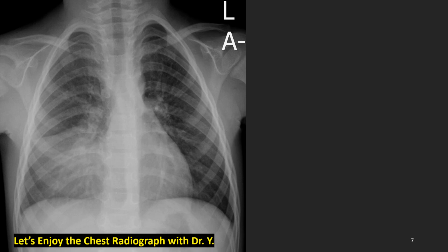What do we see with this frontal radiograph of a child? Yes, consolidation here, maybe here, around here. We see the minor fissure. How about the right heart border? Where is this pneumonia involved? Yes, that's right middle lobe. We see right minor fissure anatomy and obliteration of the right heart border. We call it silhouette sign, so it must be right middle lobe.